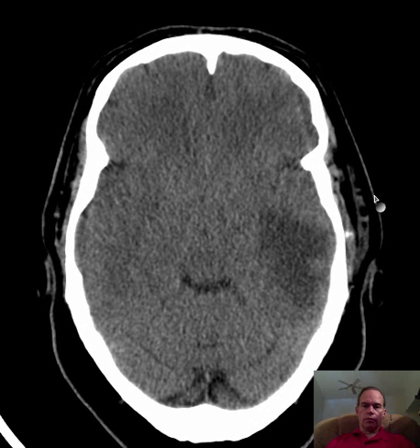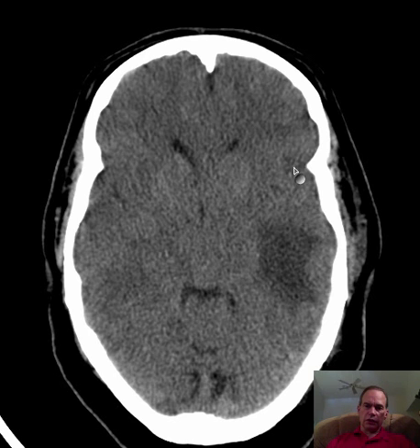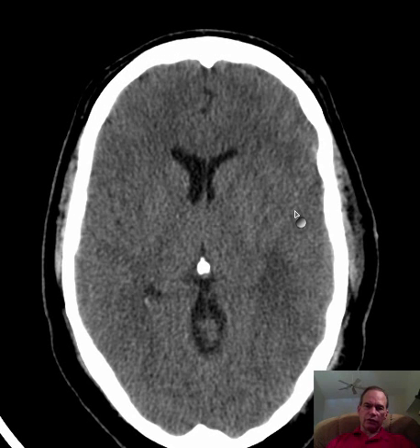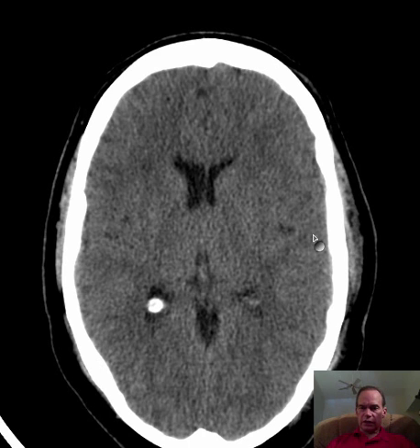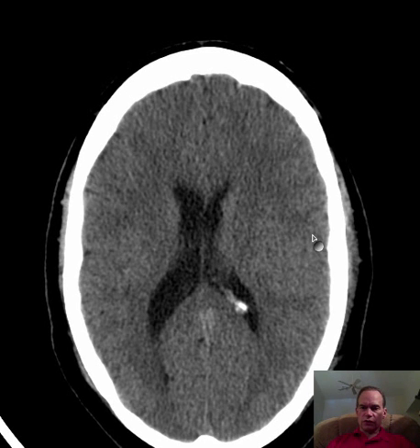Very important. Well, it's a low attenuation abnormality, and it is located in the temporal lobe. You can tell it's a temporal lobe because this little fold is the Sylvian fissure, and we have to go up more superiorly to follow that Sylvian fissure posteriorly. And here's a little bit of the Sylvian fissure here, and here you can see the folds of cortex in the region of the Sylvian fissure.